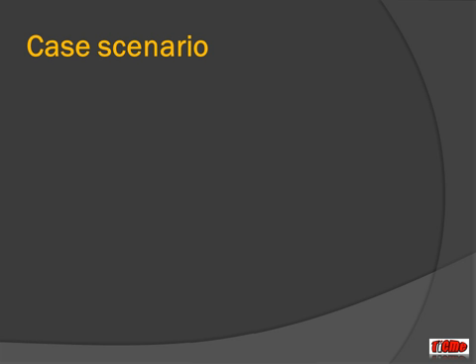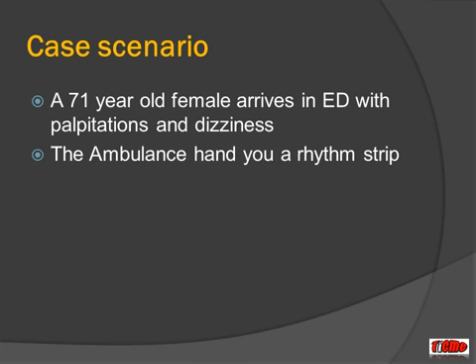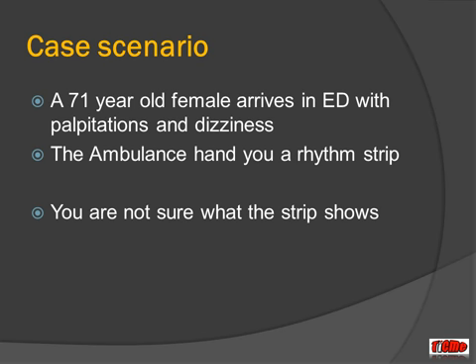Okay, let's start off with a familiar case. 71-year-old lady comes into the ED via ambulance, complaining of palpitations and dizziness. The ambulance give you a rhythm strip, and unfortunately when you look at it, you're not quite sure what's going on. You need to answer two main questions.